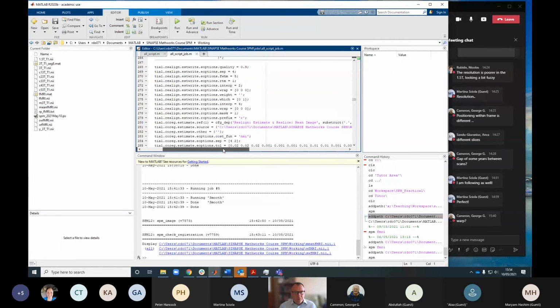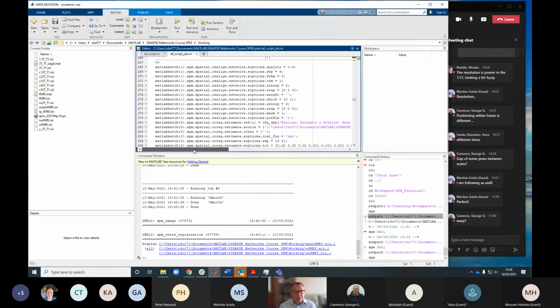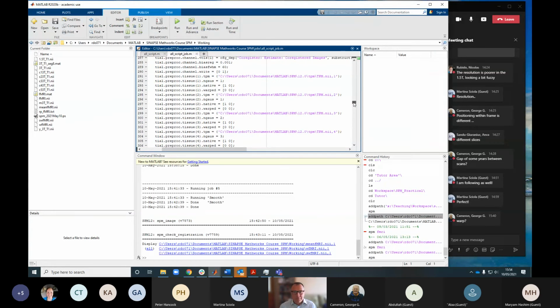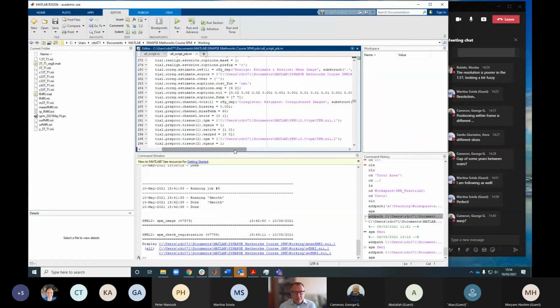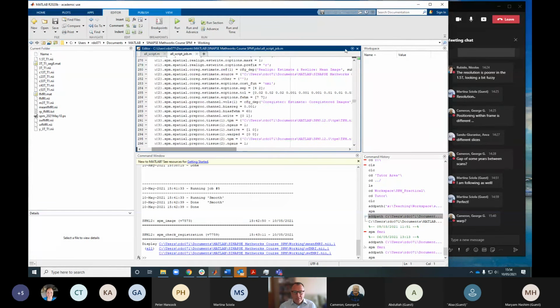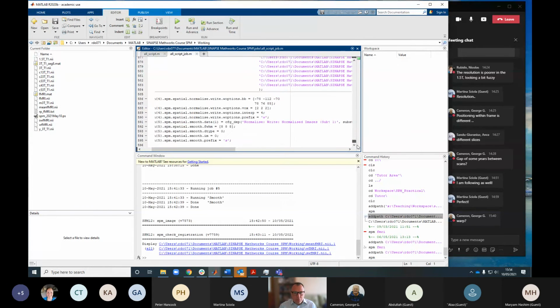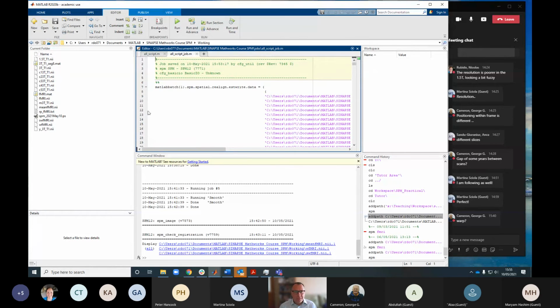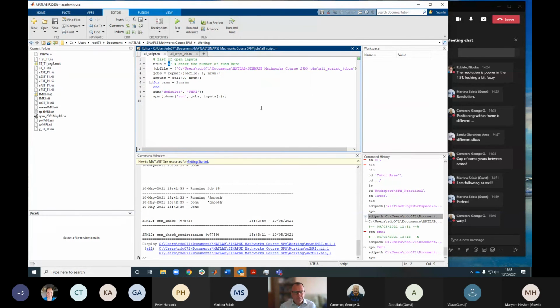And lots of the options that are in the batch editor have been copied into this essentially another MATLAB script. And we see we'll have our 3D T1 full path file name, etc. So if you want to go through the MATLAB scripting route, this will give you some basic information that you can then use to create your own script.